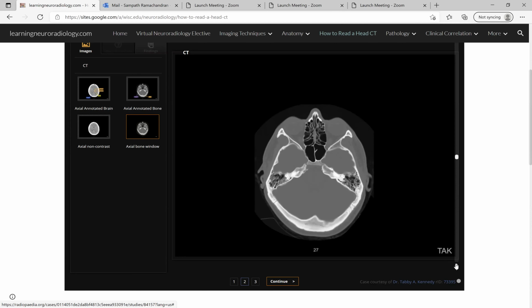So here, let me give a brief understanding. These are the mastoids, and these are typically free of any fluid. Any presence of fluid here doesn't necessarily mean that there's something wrong, but it gives you some indication that there could be something wrong. Sometimes it's difficult to really say that there's something actually going on, because it may or may not be clinically significant. So some of the things we see on CT don't necessarily mean there's actual clinical pathology.